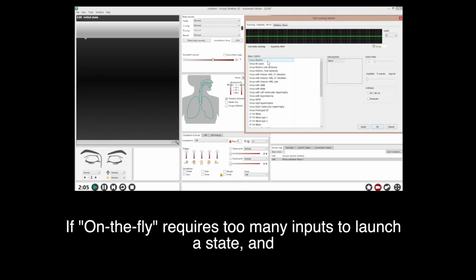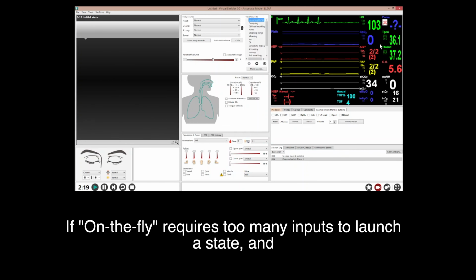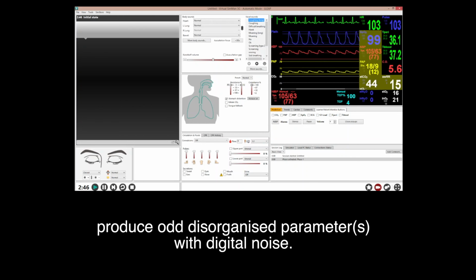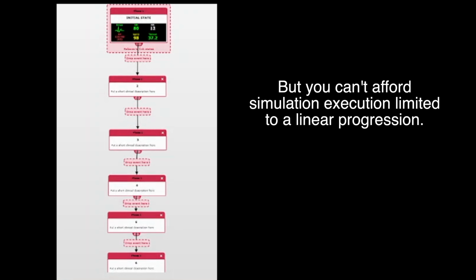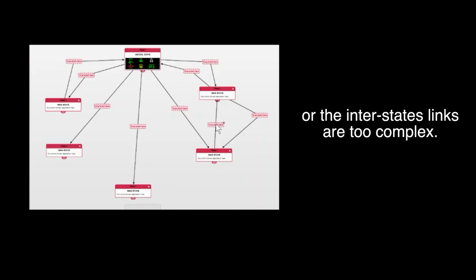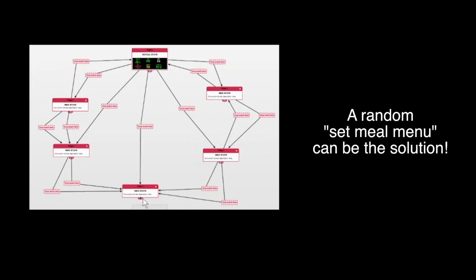If on-the-fly requires too many inputs to launch a state, and produces odd, disorganized parameters with digital noise, but you can't afford simulation execution limited to a linear progression, or the inter-state links are too complex, a random set meal menu can be the solution.